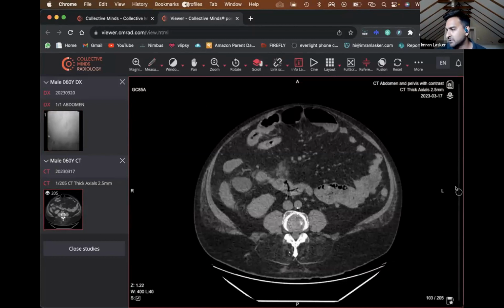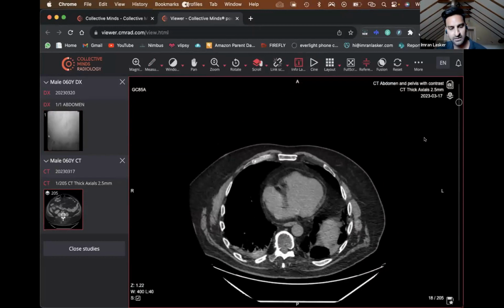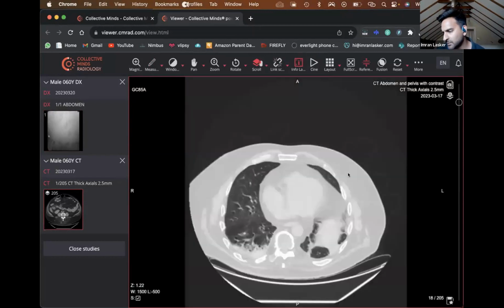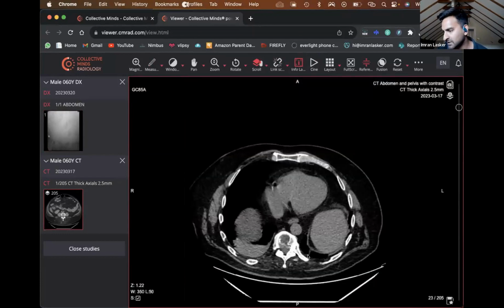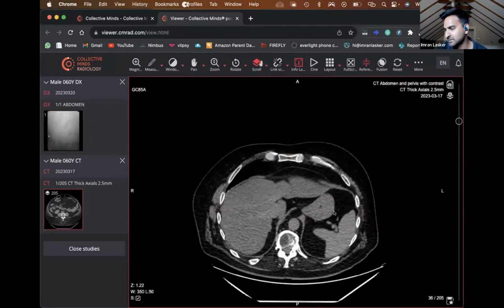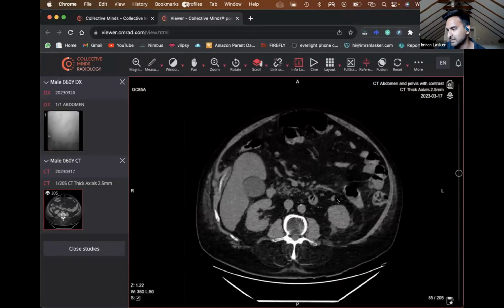So we are now going to go through the CT scan, and this is the same patient. Actually, look at the lungs here, since we've been going about lungs today. It looks like there are a few air bronchograms located there, potentially a pleural effusion. There's also a thin line there, which is some atelectasis, a kind of folded lung, a very thin band.